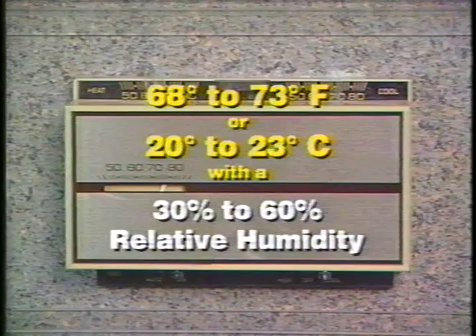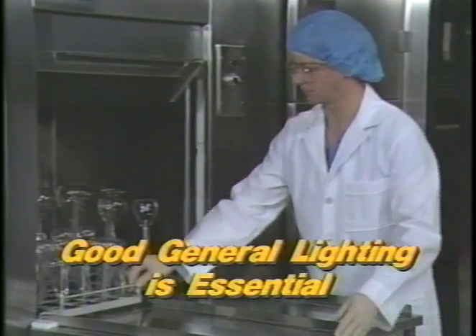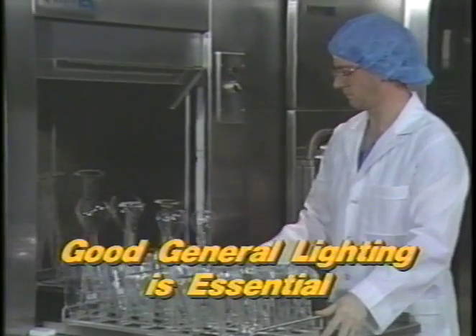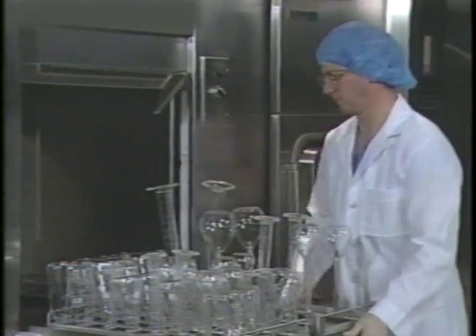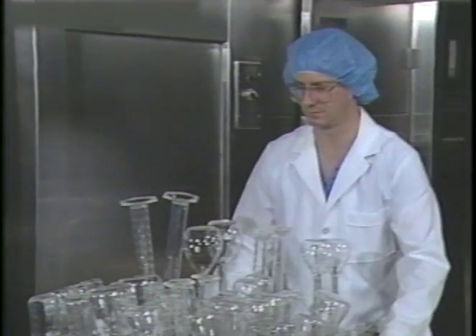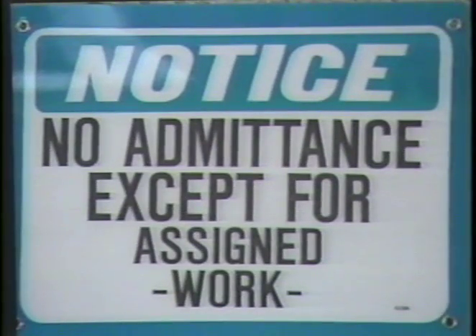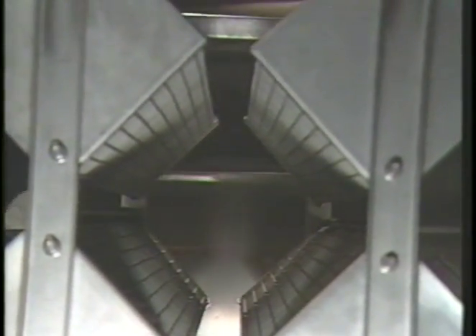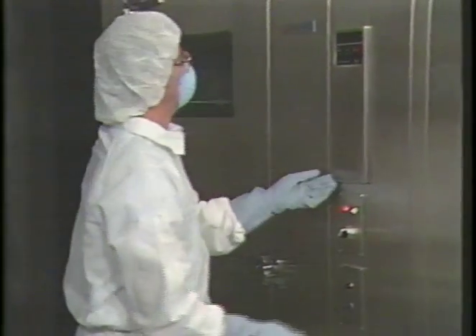The temperature should be controlled at a comfortable level for personnel working in the area. Good general lighting is essential for safe working conditions, but should also be placed strategically in areas requiring close inspection and visual accuracy, such as in areas where the completed cleansed devices can be scrutinized for cleansing efficacy before distribution and/or assembly. Finally, traffic in and out of the area should be controlled and restricted to personnel working in the area. Personnel should wear a clean uniform or cover garment to protect their outside clothing from damage and/or contamination.